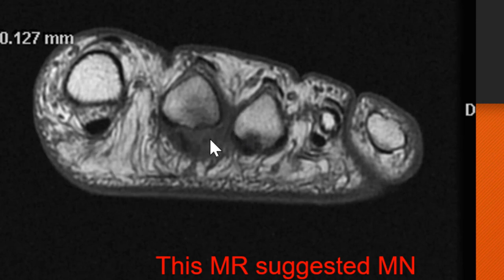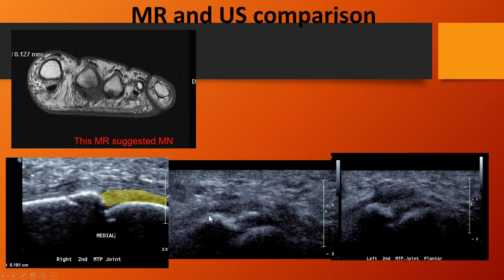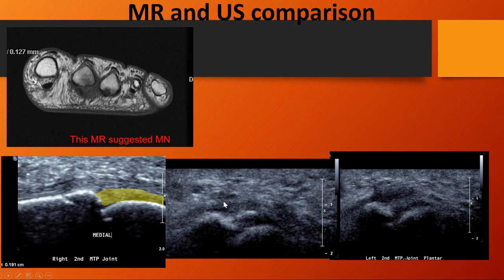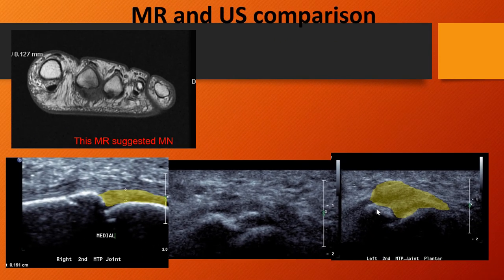So this web space was re-examined on ultrasound. We can see a nice normal thickness medial plantar plate. And then the lateral aspect of that same plantar plate looked like this. So very thick and degenerate with some osteophyte formation and little degenerative tears. So this was what was causing the patient's symptoms, clinically like capsulitis. So you push on it and it would reproduce the patient's pain.